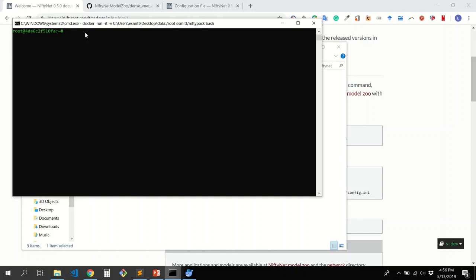That's the important key here: you don't need to install all the NiftyNet libraries and have conflicts with your installed libraries. Of course, you can use a virtual environment in Python, there is no problem with that, but you need more memory and more disk. In my case, I don't have much space on my hard disk to do that, but you can use that also.